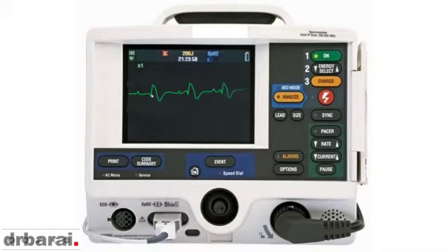There is a P wave followed by a QRS complex, P wave followed by a QRS complex, P wave followed by a QRS complex. If you carefully look at it, this QRS complex looks a bit wide. There is a bit of ST elevation, and the ST segment has a downsloping pattern, followed by an inverted T wave. This is found in V1, V2, or V3. This particular patient has it in the V1 lead. This is called type 1 Brugada syndrome.